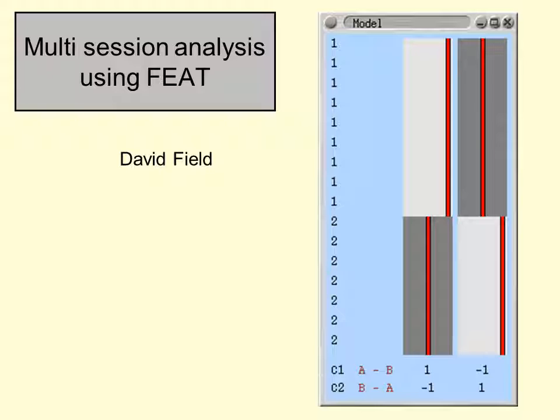Now, on the right here we've got what you might be familiar with, a design matrix, but it looks a little bit different to the design matrices you were using at the first level. For example, we no longer have time running from 0 down to the end of the experiment on this vertical dimension. We have instead some numbers that refer to the random effects groupings of participants.